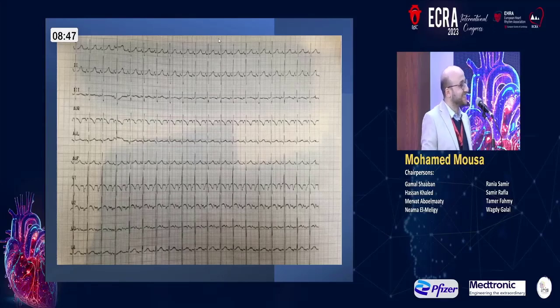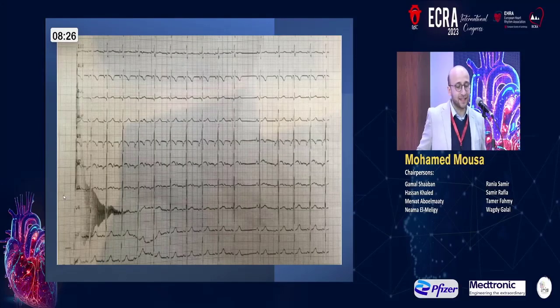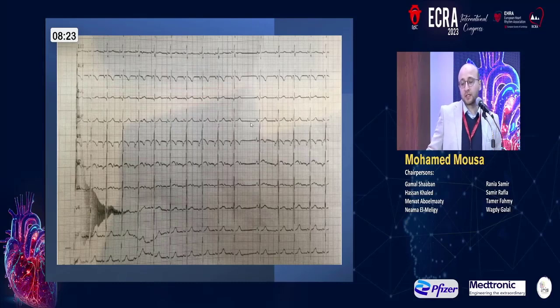Okay, this is a 12-lead surface ECG, and the striking lead is V1. As I can see, there is a negative P wave in V1, so it looks like atrial tachycardia. Next is for the patient. Here is the clue: the changing P wave morphology in V1. So it's a long RP tachycardia with a different P wave morphology from the sinus rhythm, mostly an atrial tachycardia.